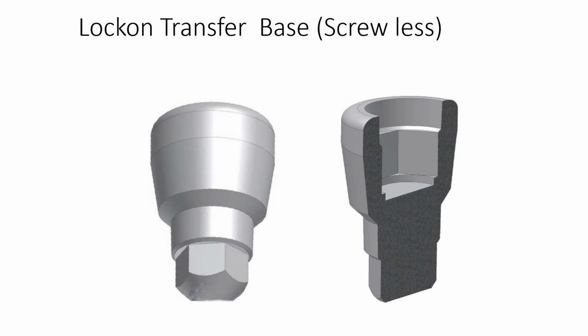We're now going to be considering our Ankorlock transfer impression system, and in particular we're going to be looking at the Ankorlock quick transfer and our transfer bases.